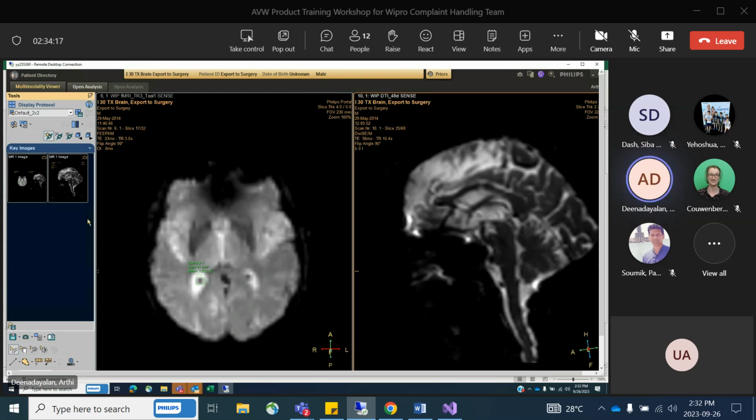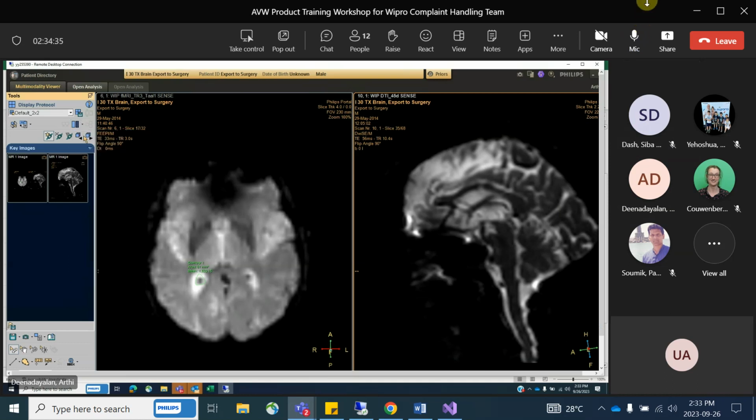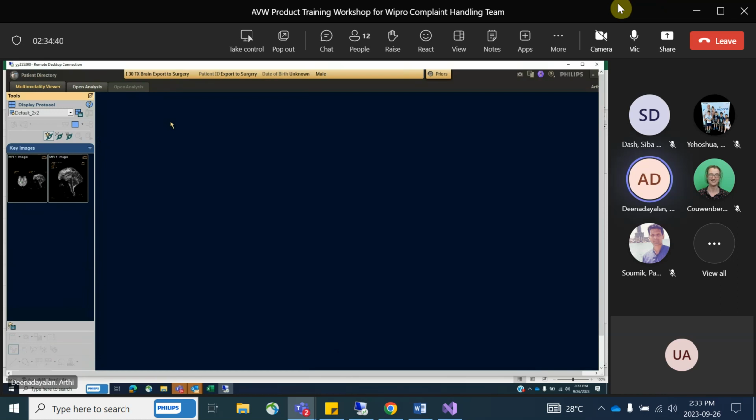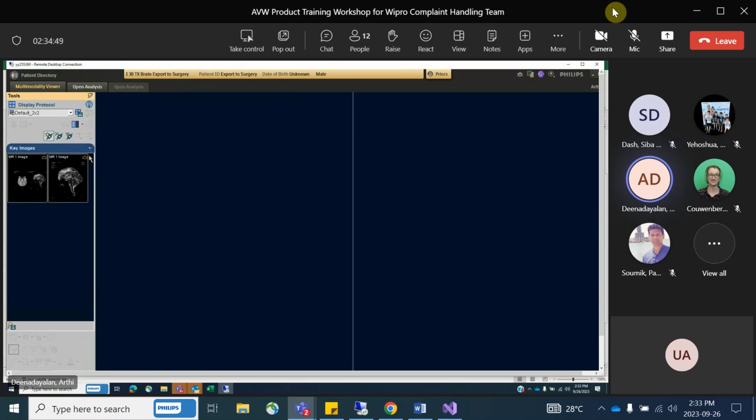Any doubts so far? Anything that you want to know? There are a few more things on MMV, but so far, any doubts or questions? Anybody? No, not for me. To link two images from two series. I'll tell you, that's what I'm going to come to next. I just wanted to finish off the basics of viewing the images and what you do in MMV.